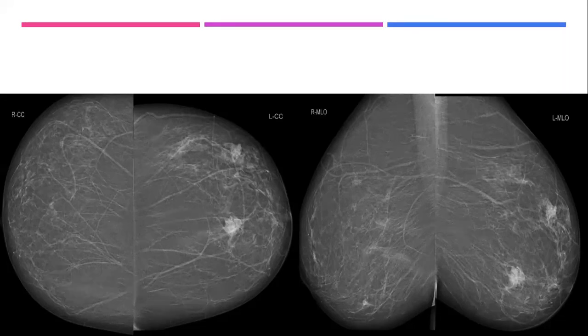Usually we classify the lesion by the more suspicious or more malignant features. Which one has more positive predictive value, the irregular shape or the indistinct margin? The indistinct. Yes. Because if I say these are indistinct, then it will be BIRADS 4B.